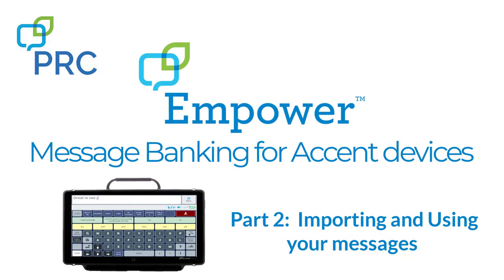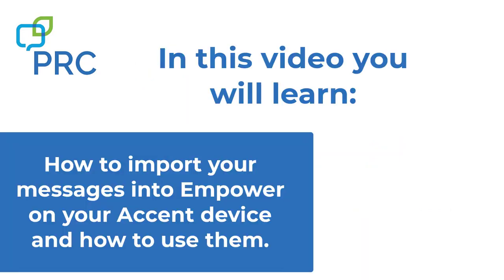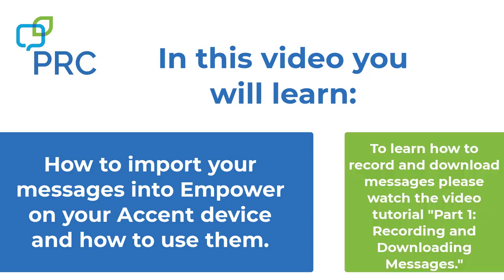Message Banking for Accent Devices with Empower Software. Part 2, Importing and Using Your Messages. In this video, you will learn how to import your messages into Empower on your Accent device and how to use them. To learn how to record and download messages, please watch the video tutorial, Part 1, Recording and Downloading Messages.